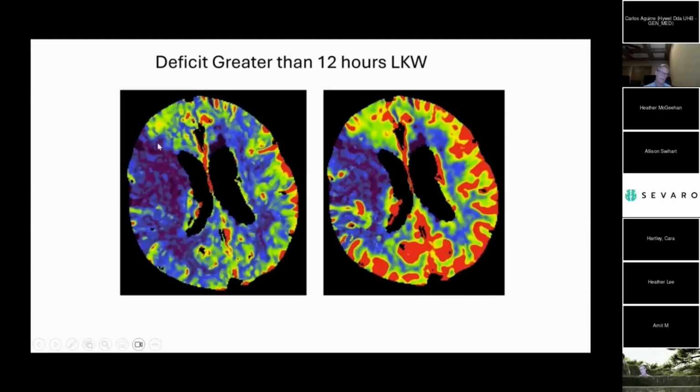We have the anterior frontal lobe, of course, the posterior frontal lobe, and the parietal lobe. Now the CBV, again, the normal is going to be red and green and light blue, and abnormal is this purple. So this is severely reduced CBV. Now think about our VQ scan example. Where this defect is, severe decrease in CBV matches this. This will demonstrate the core infarct. Now back here where the stroke is, demonstrated by the dark blue, it's actually normal. So this would be the penumbra.